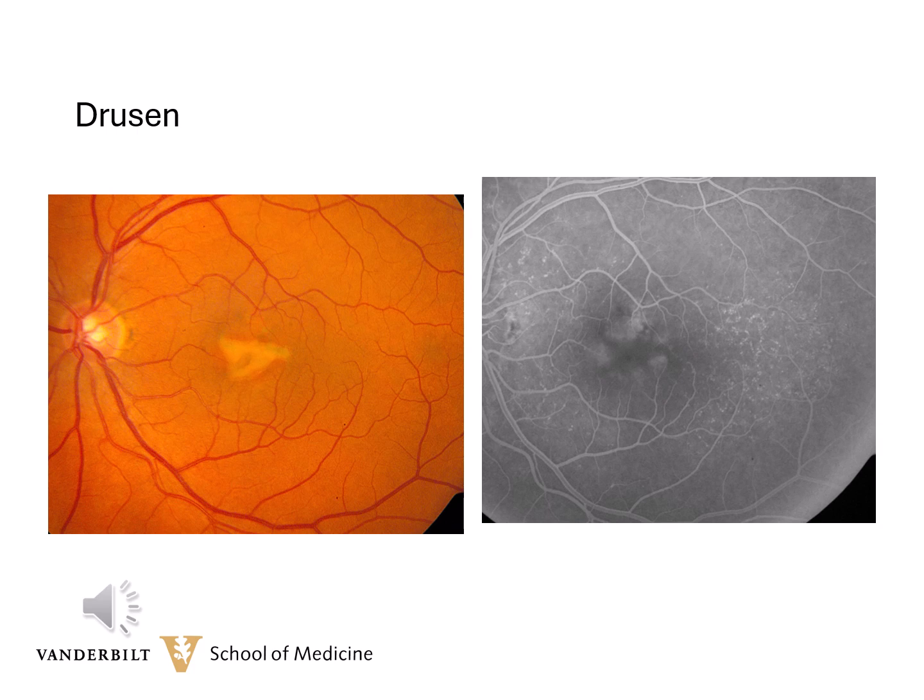We saw this gentleman earlier, but I want to present his angiogram because it shows the presence of drusen as well as the vitelliform lesion. The drusen obviously are seen much easier on the angiogram than you can see clinically. However, we will talk about the specific angiographic patterns in a few minutes.